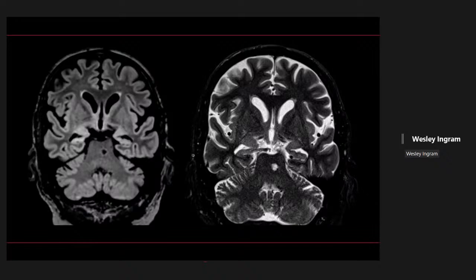The temporal lobes, looking at the hippocampi in the region of the temporal horns and choroidal fissure. I mean, there's maybe some asymmetry on the right. Maybe the right temporal horn slightly bigger. Maybe the left hippocampal formation. Maybe there's some volume loss or change in architecture. The right amygdala looks a little bigger. Yeah, that may just be cut.